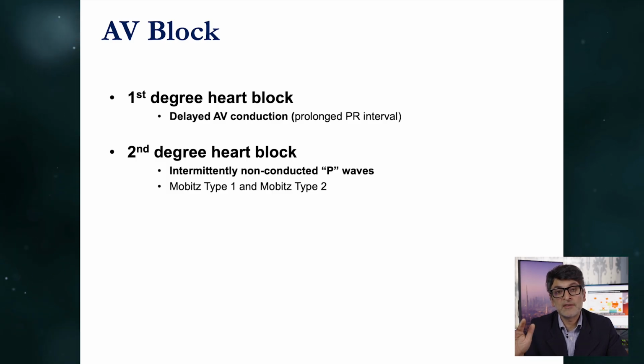Is this a concern? I'd say this is a kind of an amber flag. In a young athletic individual, we see this again because of high vagal tone. I have to say in an elderly individual, we'd probably consider this as an indication for pacing. And that's something that's now widely accepted amongst the specialist cohort of doctors that typically you refer your patients to. It's curious also to know that racehorses spend 40% of their time in this type of heart rhythm disturbance. That shows that it's a form of physical conditioning.